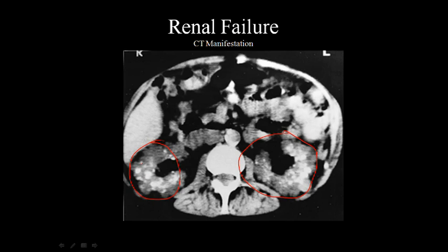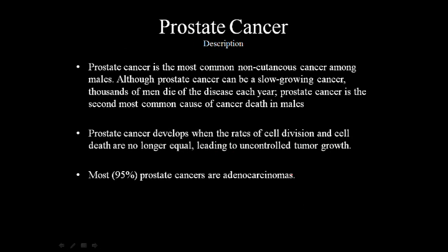One confusing factor on this image is these little areas here, which look like there's contrast enhancement, so we really don't know about this image. But the thing we're really looking for in terms of renal failure is a causation, such as a stone, or edema that could be caused by congestive heart failure, which is leading to the renal failure.